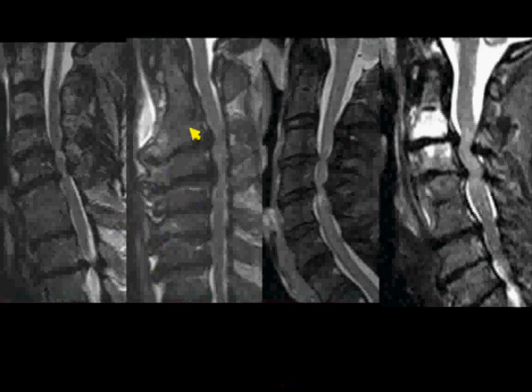Just examples of cervical spondylosis, multiple degenerative disc disease. I kind of classify this as the DISH cervical spondylosis categorization, with these exuberant ventral osteophytes, every level badly degenerated, as well as these disc osteophyte complexes smashing the cord at a couple of levels. Look for the high signal within the cord for the contusion, the myelomalacia. Each of these cases has that.